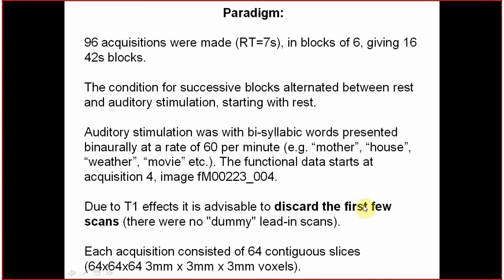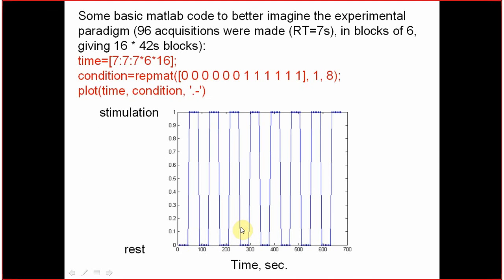The first few scans, in fact not few, but the whole first 2 blocks have to be discarded as dummies. We will get to this later.